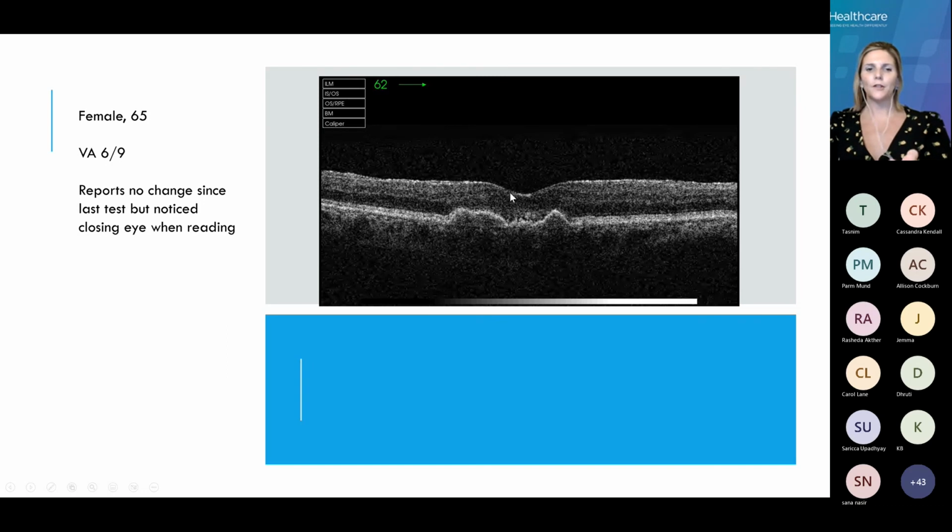So with this patient, we can see that we have a smooth sort of inner limiting membrane, maybe a little bit of sparkle, so typical, maybe an early kind of ERM happening, normal foveal depression, intraretinal section is okay. We've then got our external limiting membrane, which we can see and actually is fairly intact. We do have a little bit of change here, which looks like a little bit of pigment migration. So we do have in the RPE these sort of softer changes, don't we, in these drusen that you can probably see here.